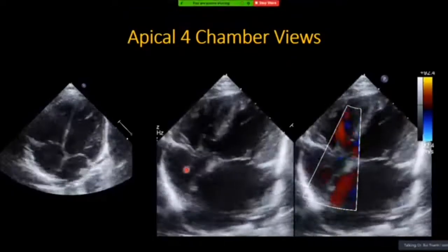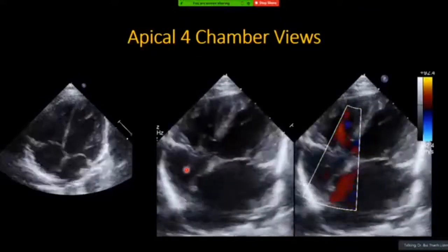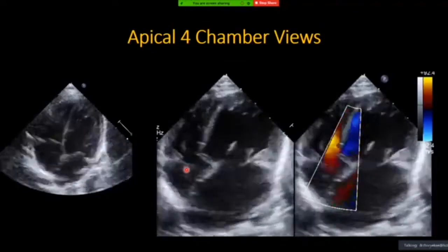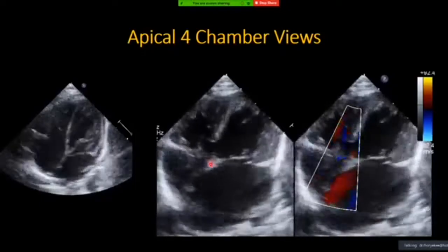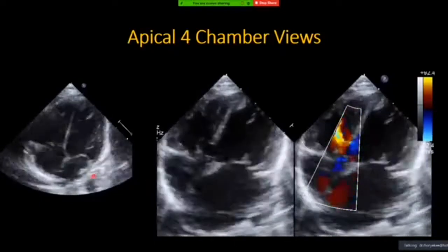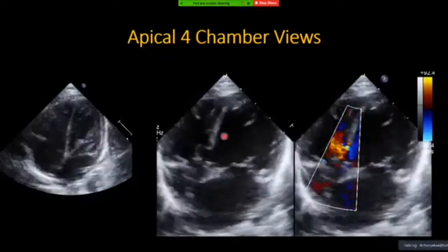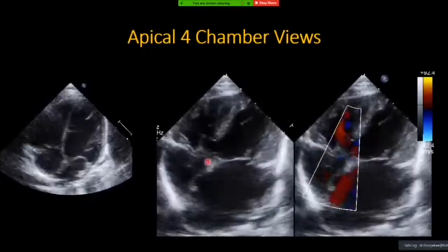Dr. Son commented, and one doctor commented, that the patient has a VSD. Anything else besides the VSD? Basically, correct. There is a significant VSD, but as we said, we go systematically, right? So now you look at the chamber size. There's a significant difference in chamber size. No doubt there is a VSD, right? So whether this VSD is causing any problem or not.